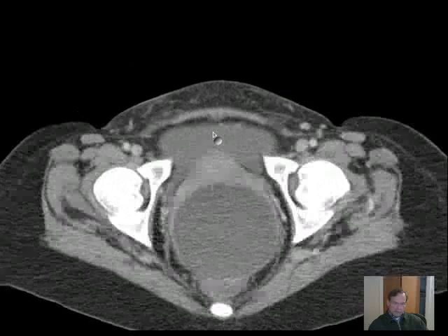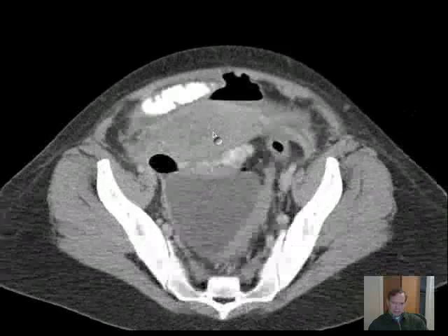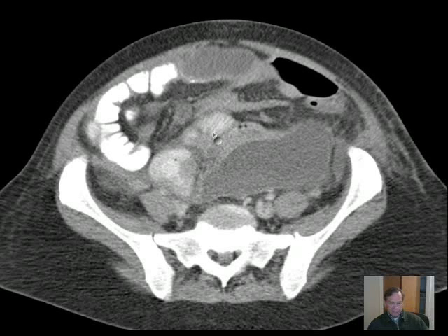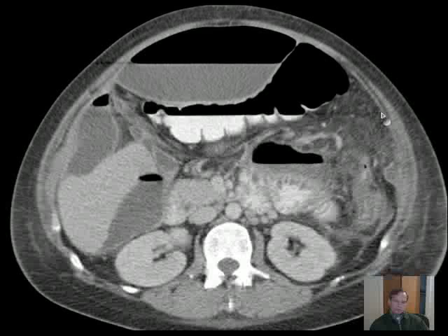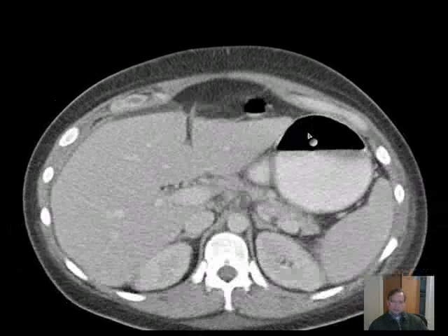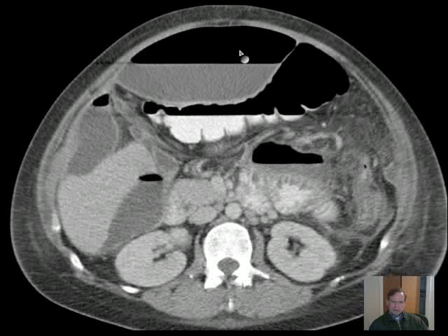So this is numerous abscesses in a patient who had a cesarean section, and this has happened presumably because bowel was inadvertently harmed, cut, or nicked, and there was leakage of bowel content into the peritoneal cavity. And I guess that's probably one of the most important aspects of this case, is to illustrate the variety of spaces within the peritoneal space that can be filled with fluid.